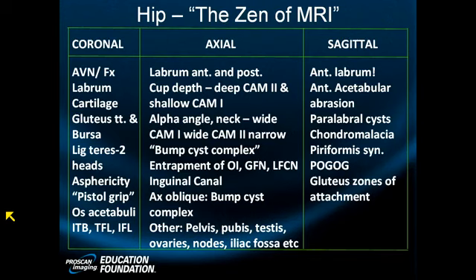There will be special sequences that you use in circumstances that require very fine resolution and detail. This is especially true when you're looking at the tiny limbus or labrum or thorn of the antero-superior quadrant of the hip. You need small field of view, heavily water-weighted, often 3D images with radial imaging, sagittal imaging, and axial oblique imaging. So when you're chasing labral tears, it becomes more complex.